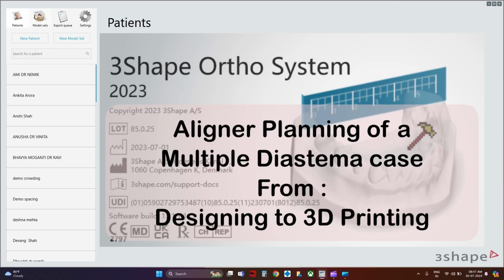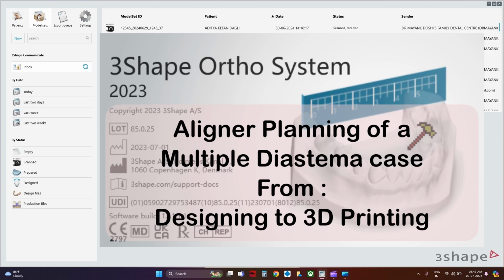Hello and welcome. Here's a step-by-step planning of a routine spacing case.